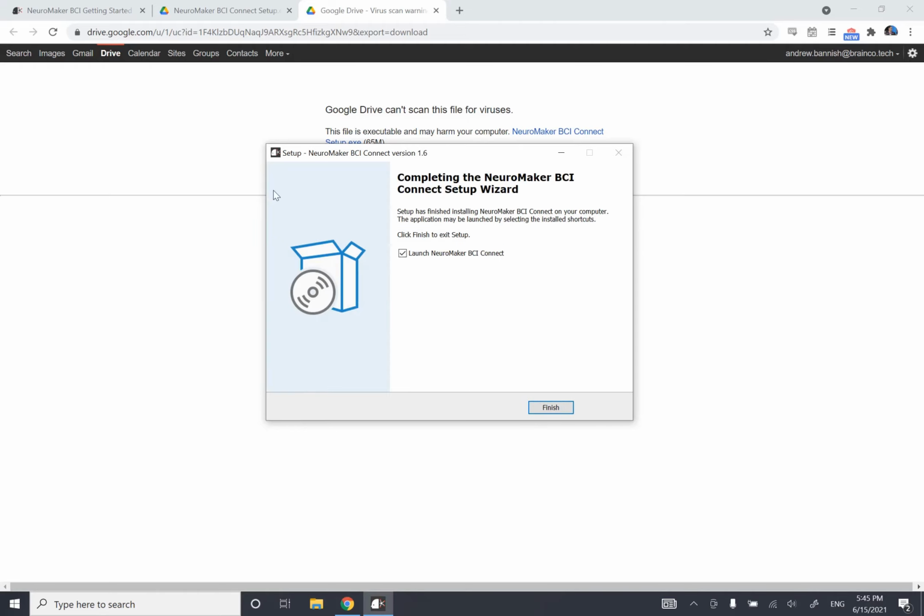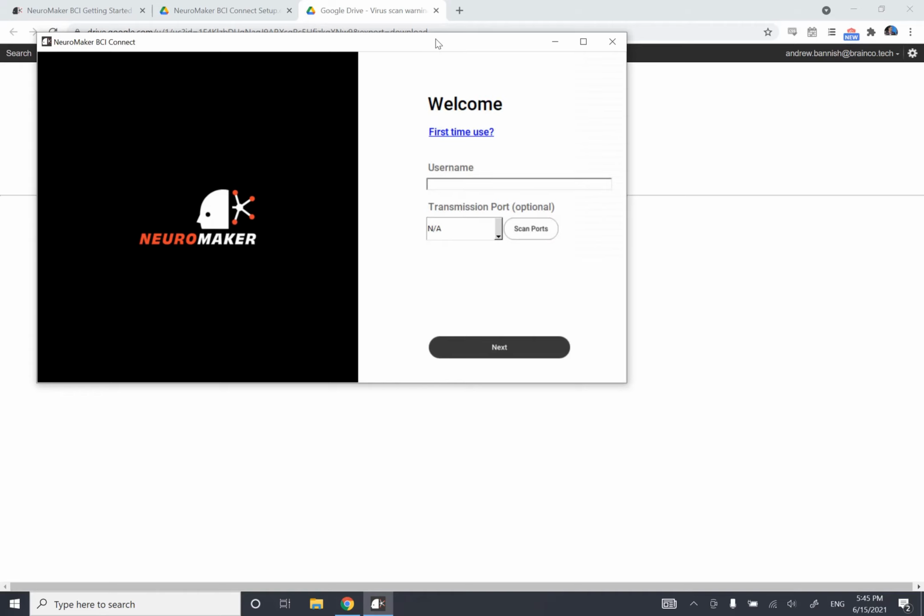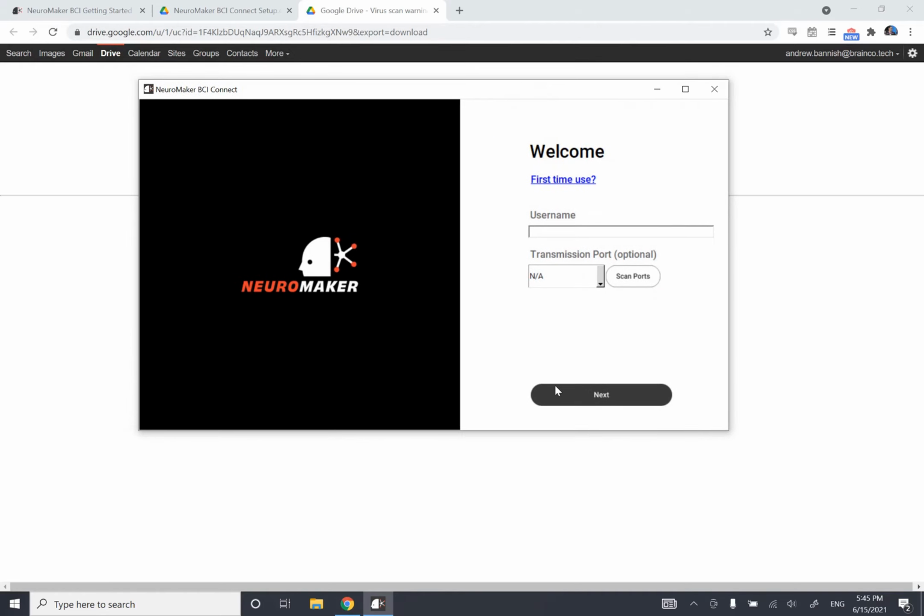Okay, so we have completed our installation. So now all we need to do is launch. So we're going to go ahead and click Finish, and this will launch our program. So in just a moment, it's going to show up on my screen. There we go. So you will see here that we have our landing page for NeuroMaker BCI Connect.